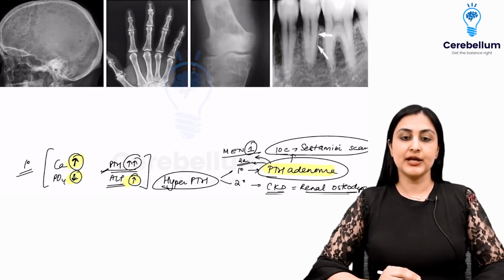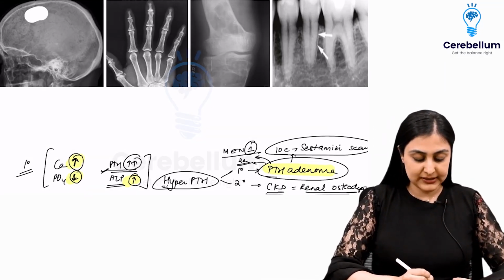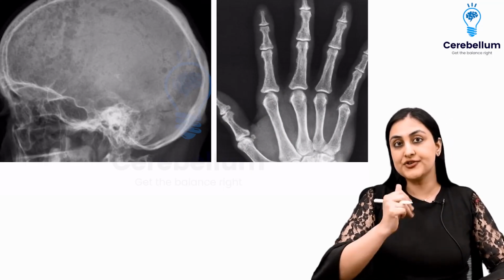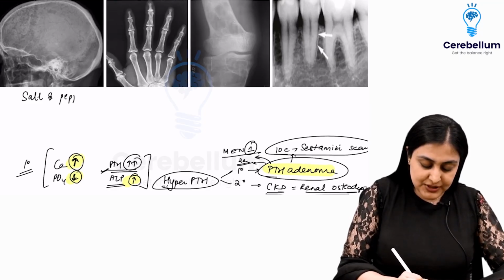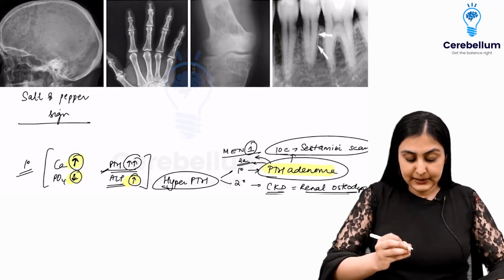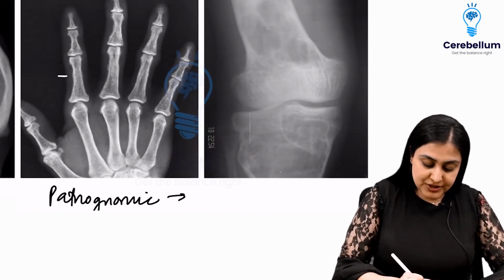So now, because parathyroid hormone is causing diffuse lysis of all of the bones around the body, those are going to be the X-ray changes that we see. So on the skull, this we've already seen in neuroradiography as well. You see that there are these very, very tiny sort of lytic lesions which represent the bony resorption. Okay, so this is called the salt and pepper sign, wherein you have these diffuse bony lytic lesions throughout the skull, which are very, very tiny.